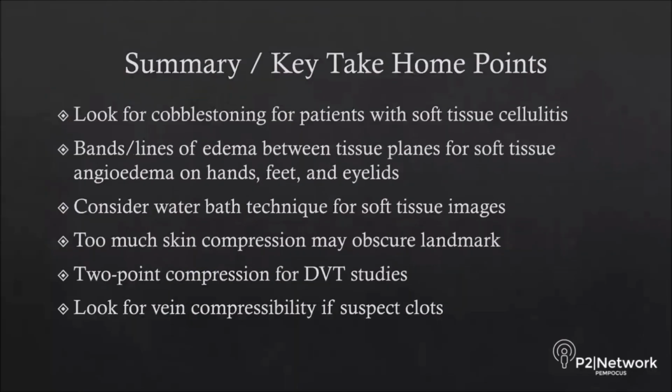Some of the take-home messages that I want you to get from this session: you look for cobblestoning in patients with soft tissue cellulitis. For patients with angioedema, you look for bands and lines of edema between tissue planes, especially on the hands, feet, and sometimes around the eyelids.